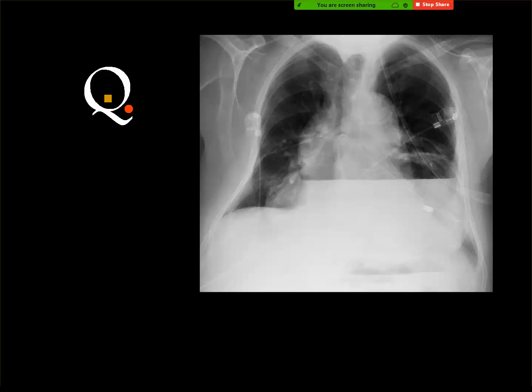Pneumothorax. Which side? The left lower. The left is clear. The left costophrenic angle is clear. Hydropericardium. Pneumopericardium. Hydropneumopericardium, but this is the right cardiac border which is free.